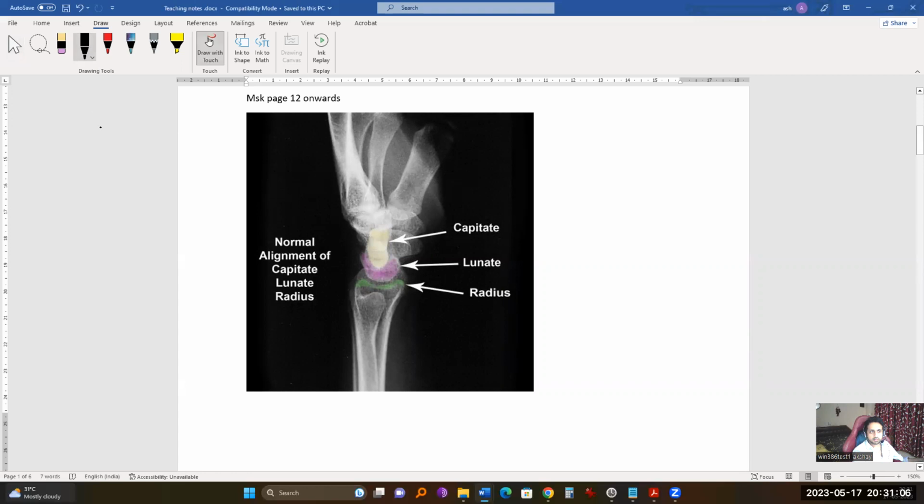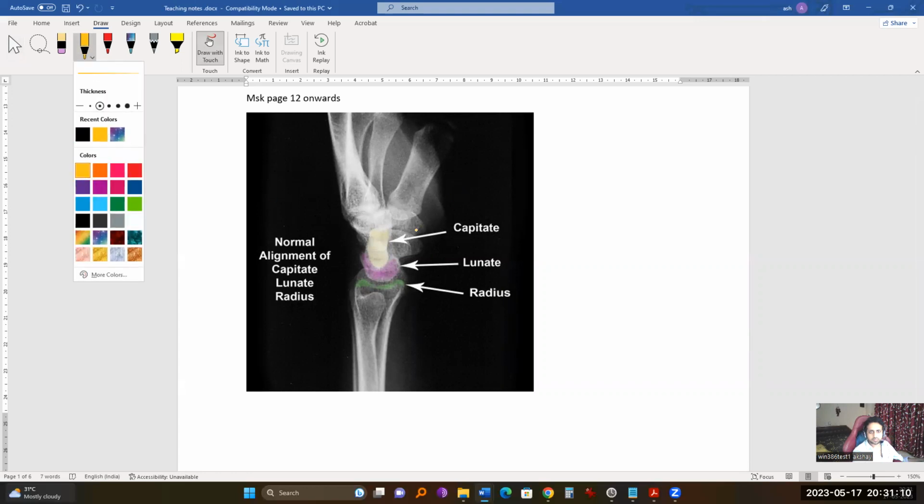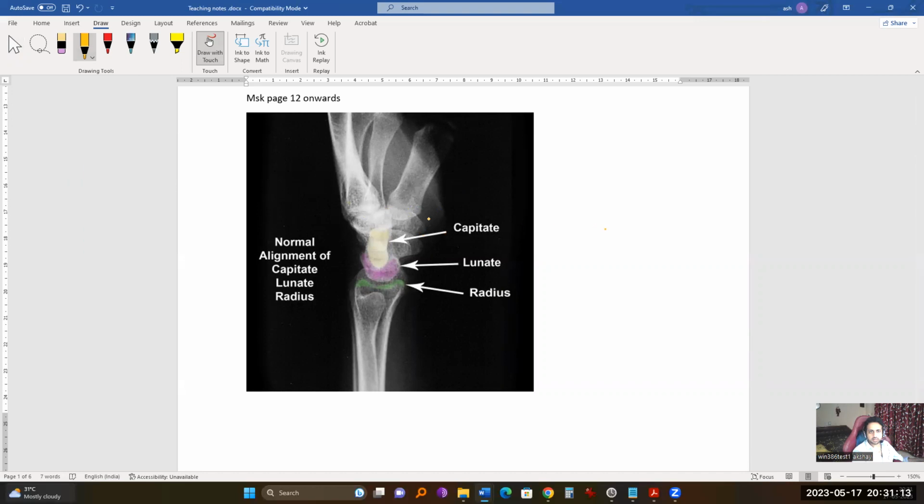And the most striking bones that you are seeing here are these two bones, which are in the anterior aspect. These two are the trapezium and the scaphoid. Now, the scaphoid is the most important bone. So I use the code TITS. This is T, then ITS. So T is the trapezium and S is the scaphoid. So that is the anterior or the volar aspect.